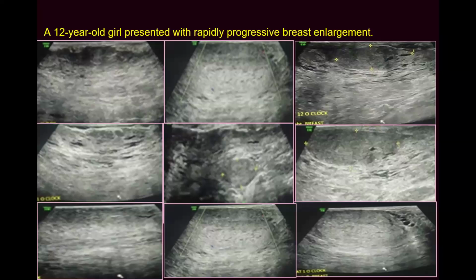For me, she needs further workup, hormonal workup. What is your impression? What is your differential diagnosis? The overproduction of estrogen and progesterone. Yes, maybe some pituitary abnormality. Her hormones were normal. Could be tumoral adenosis.